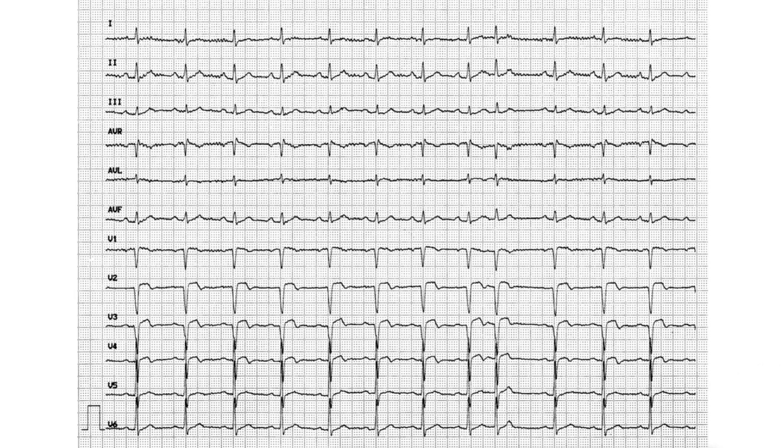Okay, and of course by 0.16 that means, because each tiny square, from the line to the dot, is 0.04 seconds, so about 4 of these tiny dots. Okay, like 1, 2, 3, 4. So 4 small boxes. That's the maximum difference of RR interval that you can tolerate.